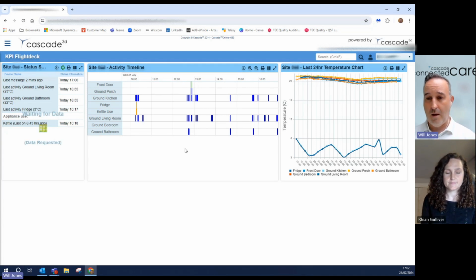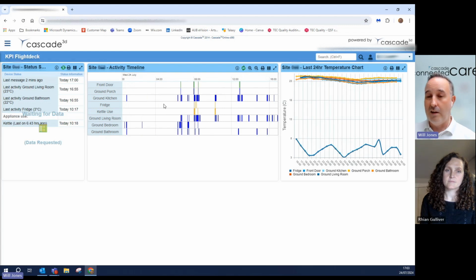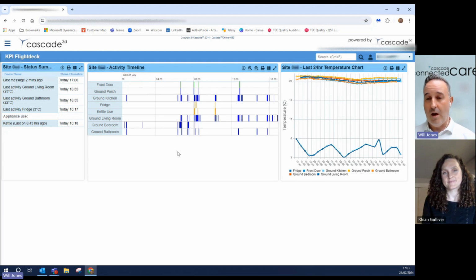She's making movements around the house. She's having a normal day. And zooming out, we can also see how that day looks as a whole, how she's sleeping at night, all the things you're concerned about at the moment, and giving you a good reassurance that she's okay and safe at home. So hopefully that was a good introduction. Any questions at the moment?